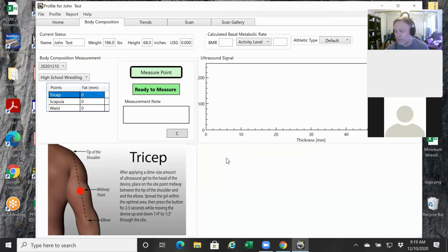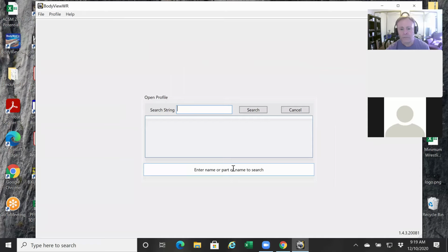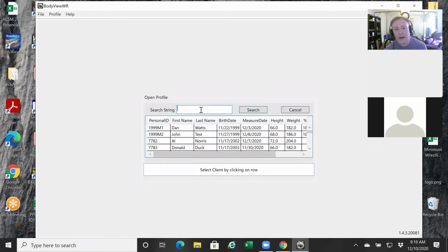So if we go back to the home page, and I apologize, some of this is redundant. I just wanted it to resonate and hopefully stick with you guys. Let's say we did create a profile already. We're going to come back here to open up that profile. You can either click search or just type in last name and click search.